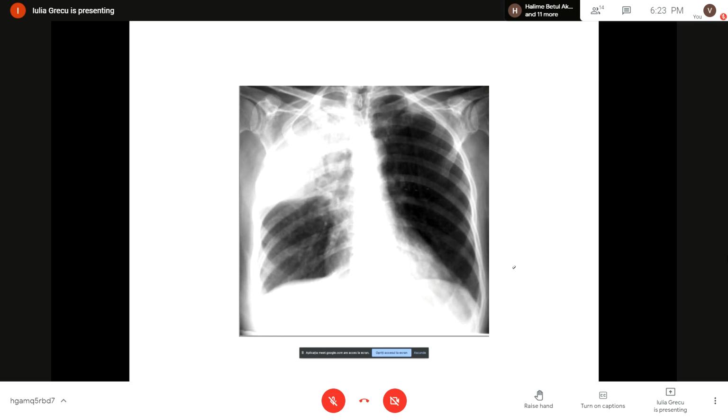Okay, and the final thing that I wanted to say is that the specific sign in alveolar damage and alveolar air replacement by other fluids is this specific sign of a lucency inside an opacity. This lucency follows the route of the bronchi. We can see lucency that divides into two smaller branches and so on and so forth.